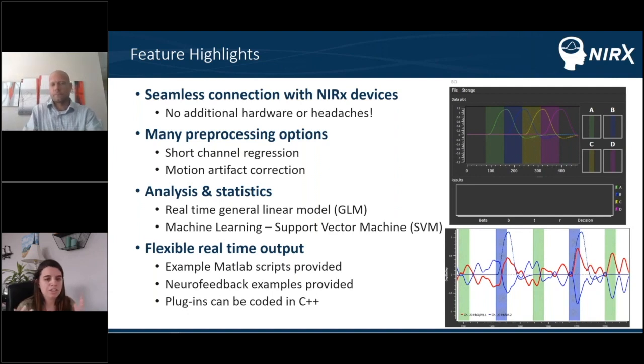Satori is really focused on getting the analysis right. It does offer some example neurofeedback and BCI little applications, but you can code your own in C++. You can export the data into MATLAB and go from there. So there are a lot of ways you can take the data once it's been analyzed. But you can also use some applications that come with Satori by default, and we'll be seeing a neurofeedback application in this presentation.